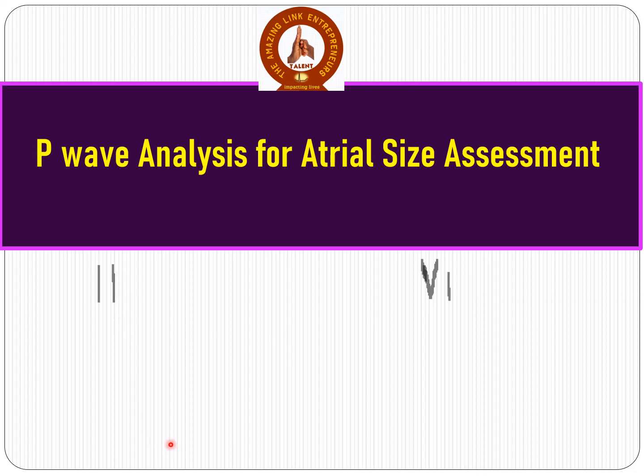P wave analysis in lead 2. This is the P wave.